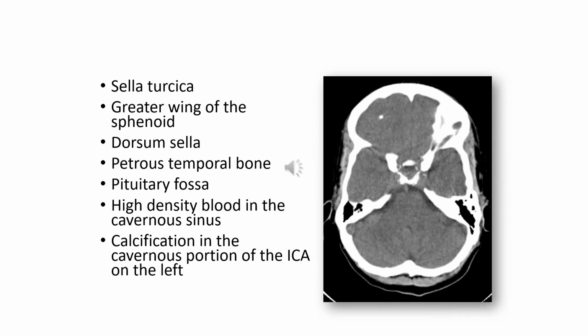In this image we see the sella turcica, a midline depression within the sphenoid bone. If you click, you'll see a magnified central portion again. The red arrows show the right and left greater wing of the sphenoid, either side of the sella turcica as this depression. The yellow arrow shows the posterior elevation of bone forming the dorsum sellae.